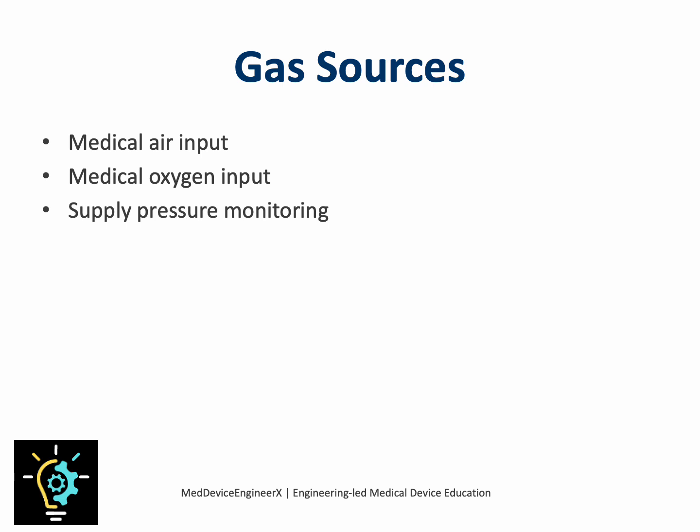Blocked filters, low wall pressure, or even incorrect hose connections can all affect downstream performance. The ventilator assumes that supplied gases meet medical standards, and it is the job of the engineers to verify the integrity of the supply before investigating internal faults.